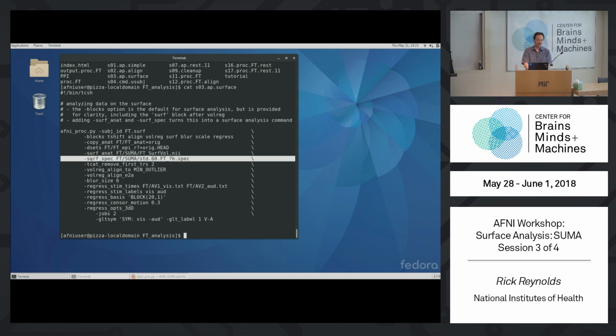If they're the same, I'd have to look at how afni_proc deals with that, if you can just use the same volume there. I haven't done enough to answer that for sure, if you'd need to specify it twice or something. But if you specified it twice, the registration should be really easy and accurate. In any case, the registration should be really easy because this is a T1 from the same subject. So the registration will be really good.